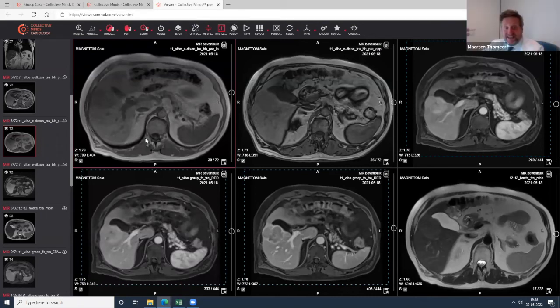So this is an HCC in a non-cirrhotic liver, and we see it quite often in the latter years. It's often due to steatosis of the liver, NASH and NAFLD. But I have the impression that often I don't see any fat in the liver. So there are quite normal livers with HCC. I see it more and more. I don't know what could be the reason for this.